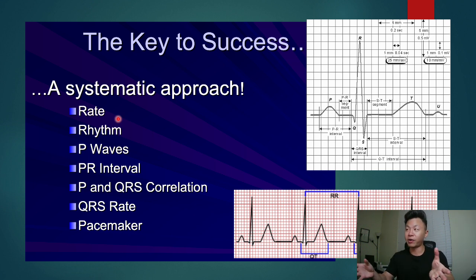As you've learned in your vital signs, below 60 is bradycardia and above 100 is tachycardia. You need to find that rhythm, which we measure by R to R. We're going to take this one R. So let's take a look at that real quick. We're going to take this measurement of one R, and we're going to make sure that it's the same measurement from the next R to the next R, right there. So that's one thing we're going to take a look at.